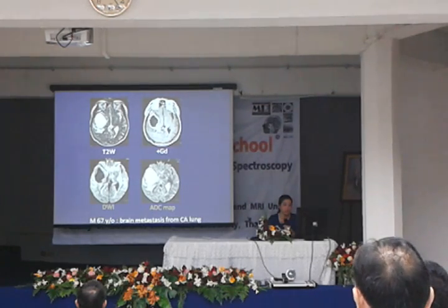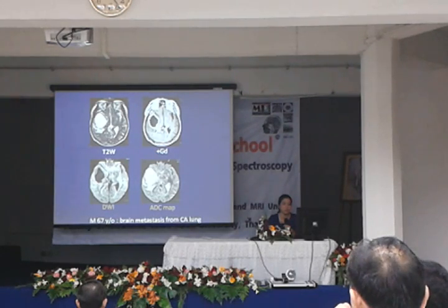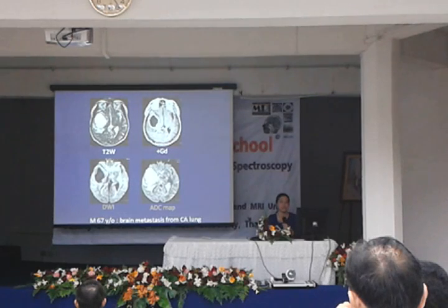And this one, the male 67-year-old, we saw a similar lesion to the last case with a wall of the lesion, but DWI doesn't show restricted diffusion, it indicates free diffusion. That means inside the lesion, the water molecules can diffuse more freely than in the last case.